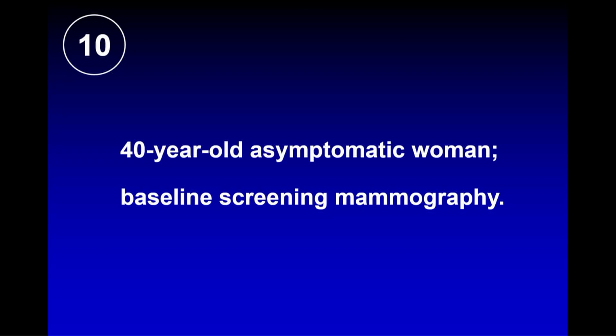We will always check. One of the reasons I know it's 100% accurate is whenever we have one of these cases, like Mike said, I write the name down. And then I go back and look a year later, because she's going to come back for routine screening in a year, and then I don't see it again, and that validates that it isn't real. That's how I know it's 100% accurate.